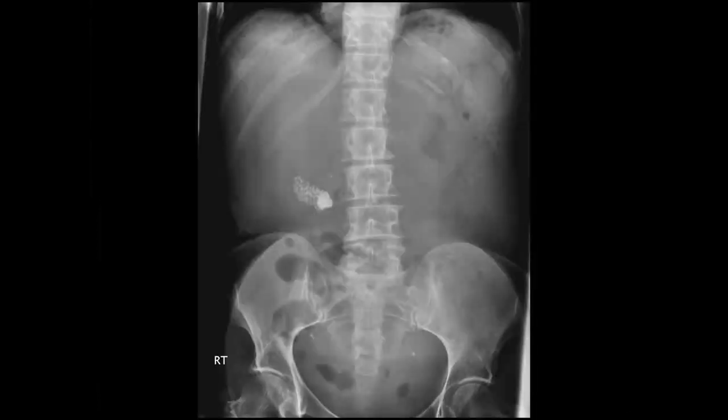So here we have got an abdominal X-ray, patient presented with abdominal pain, and as a routine you do an abdominal film. We did one, and if you look here, there are some closely packed calcific densities projected over the right upper quadrant, and there is one small separate opacity. So this looks like someone has packed small stones or gravel in a very close sac, and the sac-like structure in this area got to be, is it gallbladder? Yeah, that's correct.